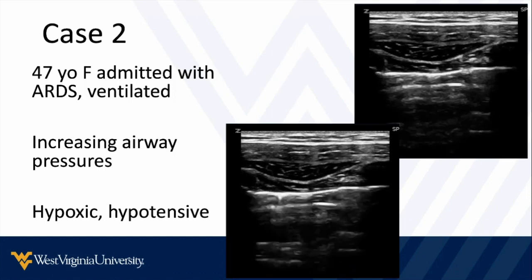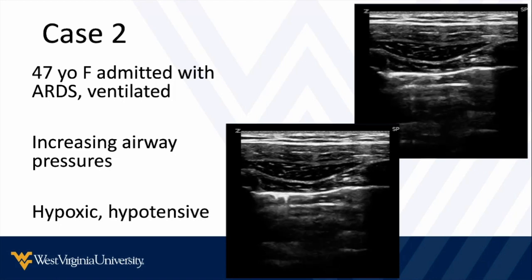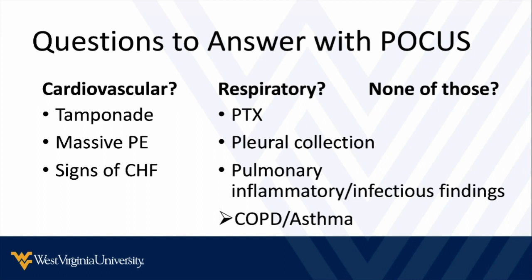Or if we see the pneumothorax, we can be more confident in making that decision to go ahead and perform a needle or tube thoracostomy. So that's the first one. Is there pneumothorax or not?